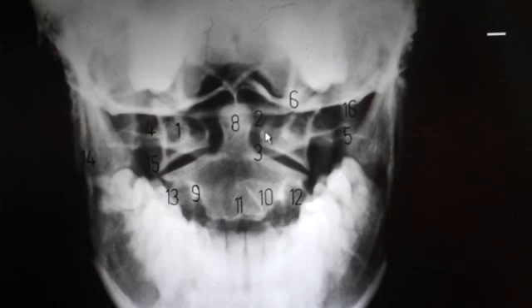Number 2 is identifying this structure that is going across. It starts right here and goes across like this and like this and like this and comes down right here. Number 2 is the anterior arch. It kind of goes up into a frown position, if you will. Whereas the one that is coming down like this, more like a smile position, number 3, is the posterior arch. It goes all the way up to the lateral aspect of the lateral mass, crosses over and superimposes part of C2, and goes up to the lateral aspect of the lateral mass on this side. So that is the posterior arch.